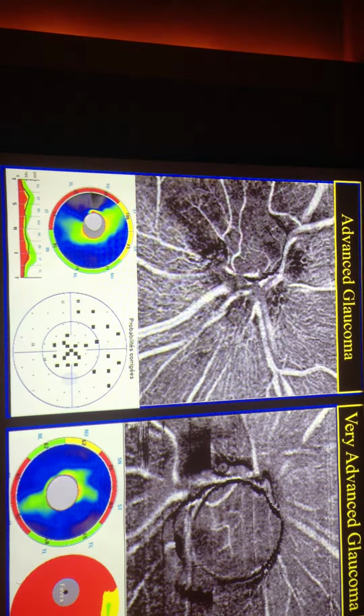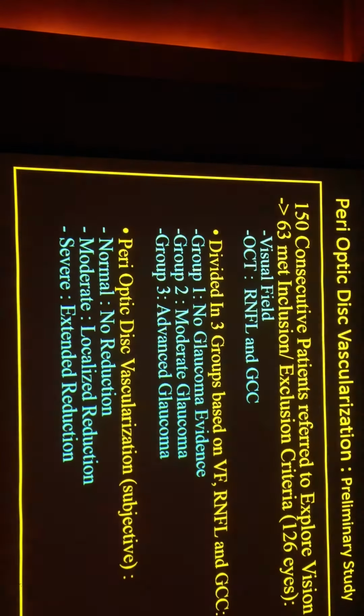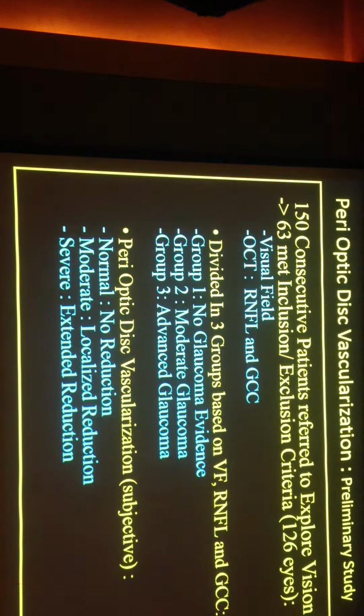And when we go to a very advanced glaucoma grade, you can observe that we have no vascularization around the disc. So, when we saw these first patients, it was impressive. So we decided to conduct a study, and we decided to follow 150 consecutive patients referred to our center.